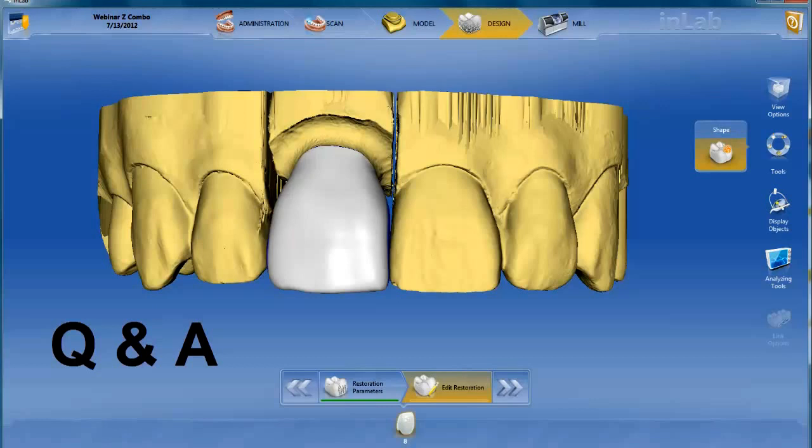After you drag an image or images to the other catalog, a warning pop-up is going to pop up and ask you to select yes to copy the images into the catalog or select no to move the images to the other catalog. You want to select no here because if you select yes, you're going to have duplicate images in catalog A and B. So probably the best way is to select no, or else you're going to go back and do a bunch of deleting.